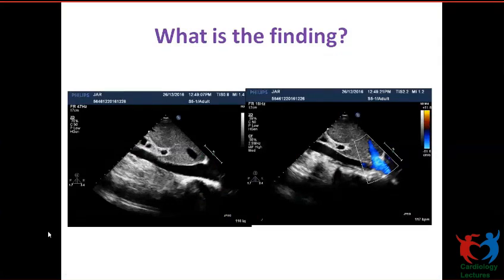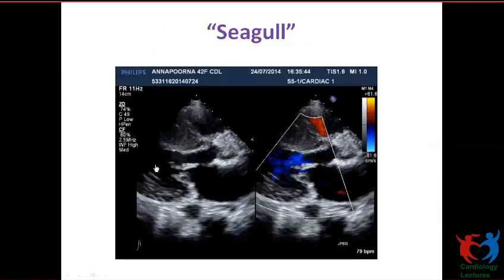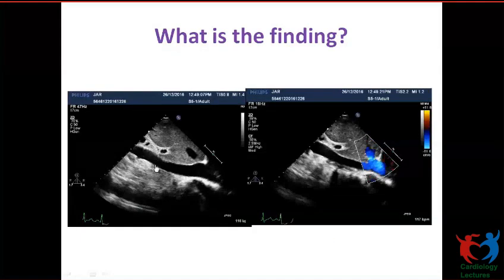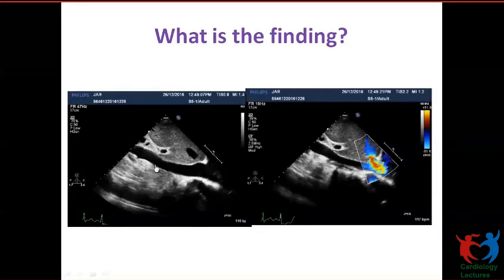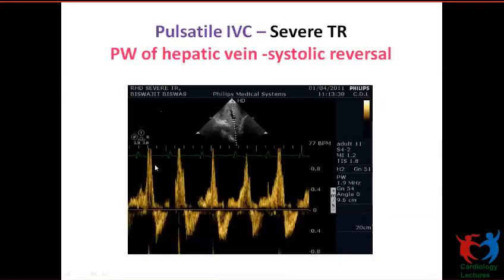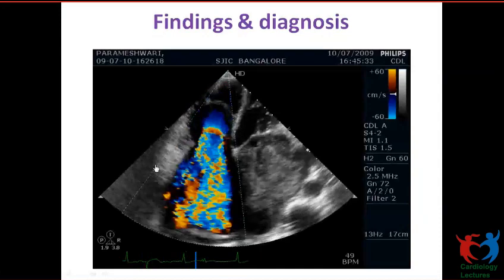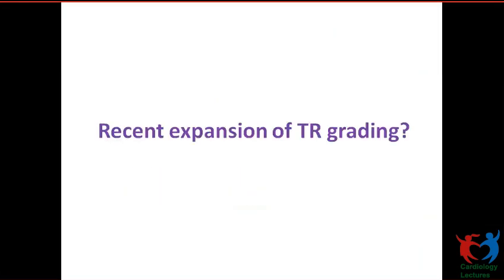Gating is actually, yeah. Okay. Are you able to see? Yes, ma'am. This cannot be respiratory, right? Unless the patient has tachypnea. So this may be some kind of massive or torrential TR. Okay, shall we go on?